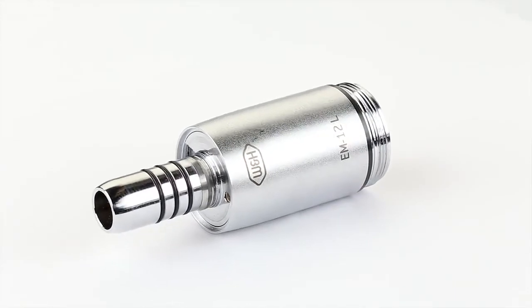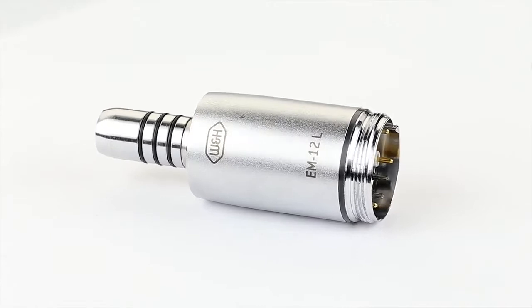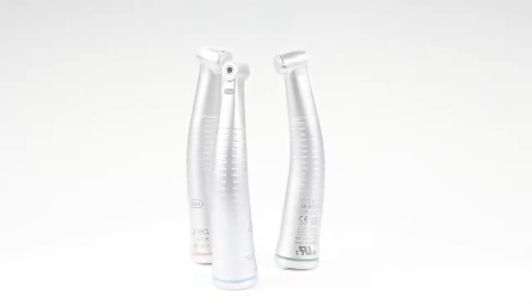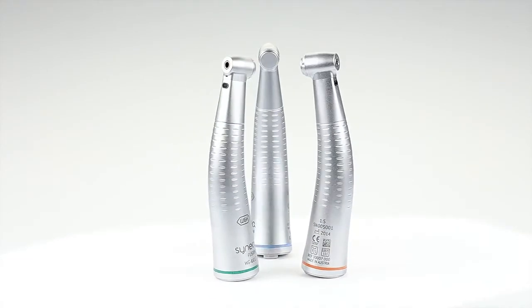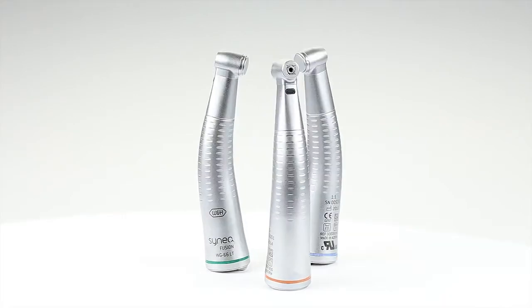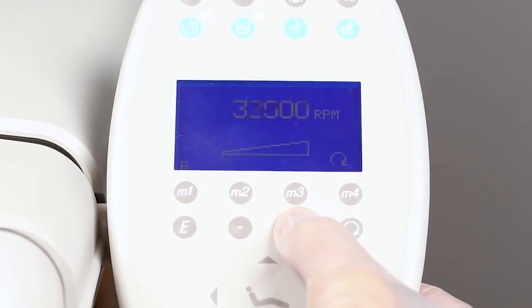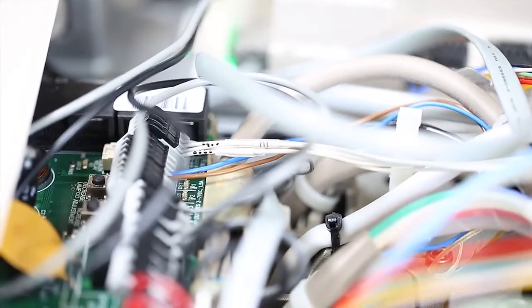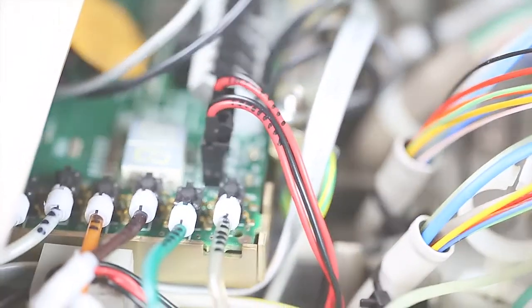Dental electric motors allow, depending on the control system, minimum speeds from 300 rpm and maximum speeds of up to 40,000 rpm. Fewer straight and contra-angle handpieces are therefore necessary to cover all speed ranges required. The required speed can be set exactly, and the electric motor always provides the power required for the requested application. In comparison to air-driven systems, electric motors, including the control system required, are more costly.